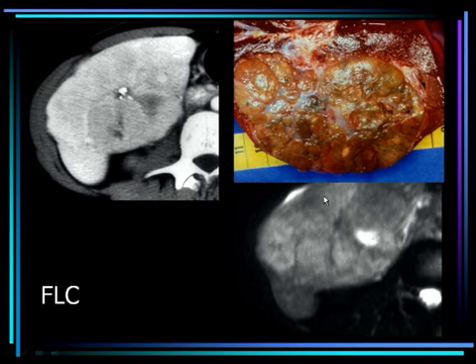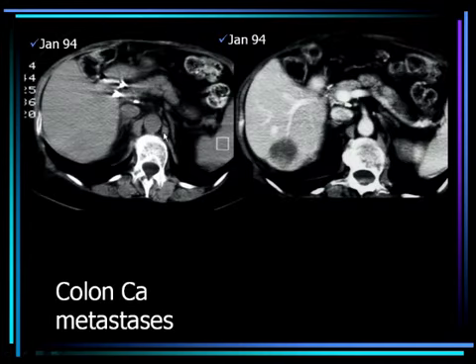Like in this case in MRI, this is a T2 weighted image. T2 means that the water is white, the rule of 3W: white, water, T2. So we have a T2 image with the lesion, and you have the same lesion by CT, and you see on CT a little calcification in the center. So although it looks like focal nodular hyperplasia, the lesion is fibrolamellar carcinoma, and fibrolamellar carcinomas demonstrate central calcification. So sometimes CT is superior to MRI because of this help.